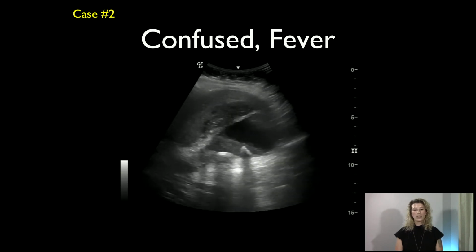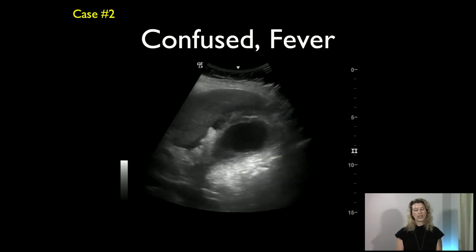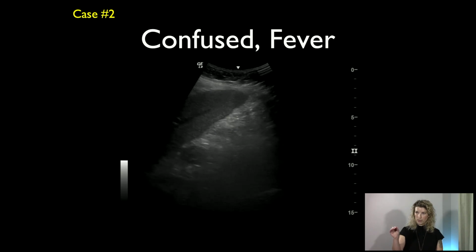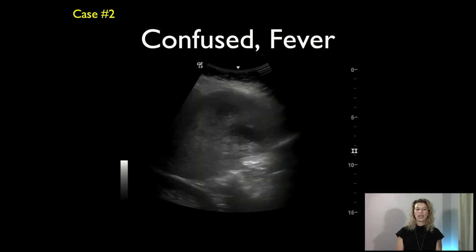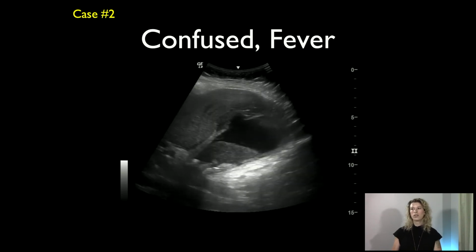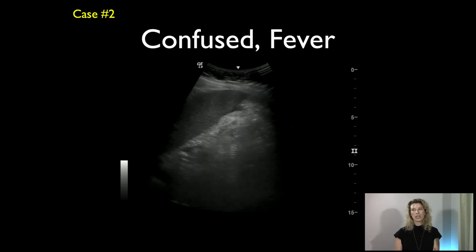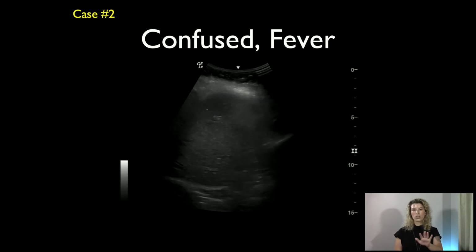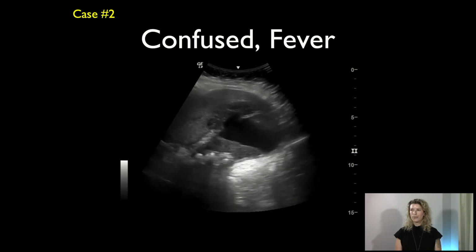So in the beginning, when you're learning how to do a point of care ultrasound and you're doing gallbladder ultrasound, if you find cholecystitis and it looks like minimal amounts of pericholecystic fluid and the patient's maybe not super sick and septic, I would say it's okay to say, this is what I found, and show your surgeons the images. They may want something else. If they're the expert consultation, do what they want. But in a patient that comes in like this, that's so sick, and their findings on point of care ultrasound are so bad, I would be worried that I missed something like a perforation. Thank you, that's great.